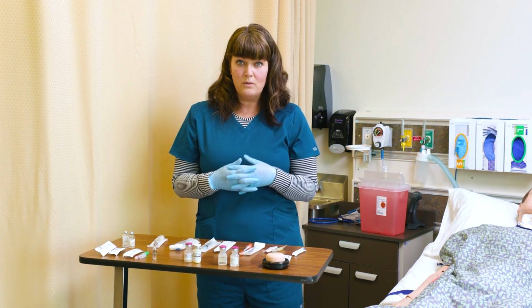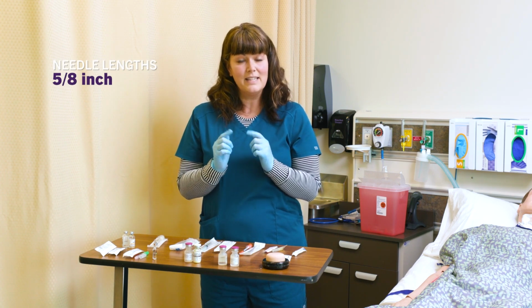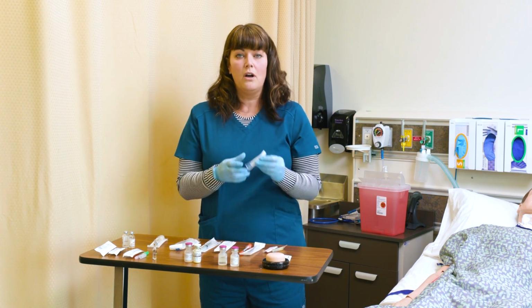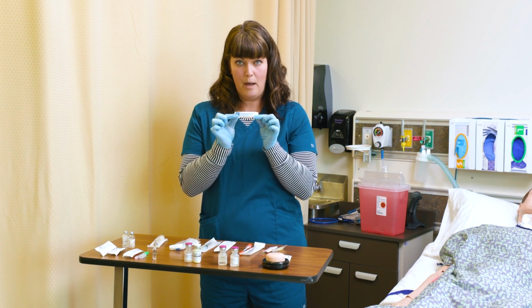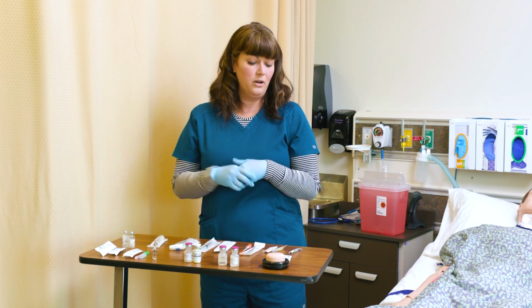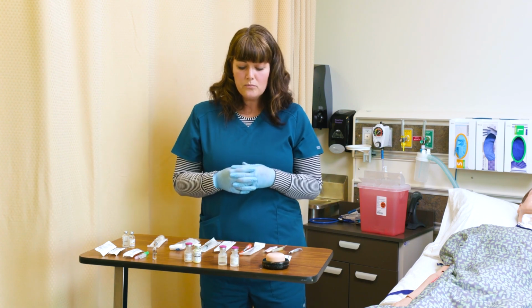The other thing we need to look for is the length of the needle. Depending on what site and what type of injection we give, we need to determine whether we need a 5/8 inch or up to a 1.5 inch. And those are all listed on the wrapper of your needle. So all that selection is done before we actually administer and we decide what site we're going to use.